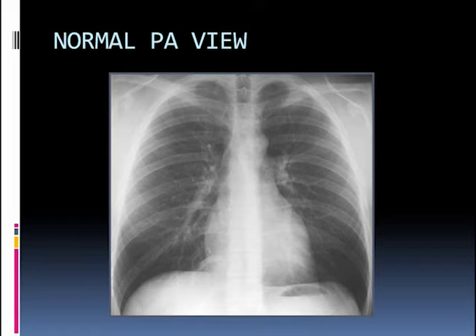First of all, in the center of the X-ray is the heart. On the right side we have the chamber called the right atrium, and on the left side we have the left ventricle. Now the reason we see the right atrium and the left ventricle is because there's air next to soft tissue. More X-rays go through air than go through soft tissue, and the soft tissue tends to stop many of the X-rays. So we have an interface between an X-ray rich area and an X-ray poor area, and that interface allows us to see the diaphragms on each side and allows us to see the mediastinal structures.